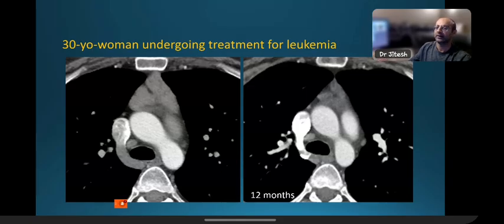If I'm reading this case, I know this patient has a malignancy, which is a stressful situation. And it's common to see thymic hyperplasia or rebound thymic hyperplasia in these patients. When I see this kind of imaging pattern, typical bilobed triangular shape conforming to the shape of the thymus, with some interspersed fat in between, I'm very comfortable calling this most likely a rebound thymic hyperplasia. I would recommend a follow-up CT in a couple of months to make sure this is either remaining stable or resolving. So that's what we did in this patient.